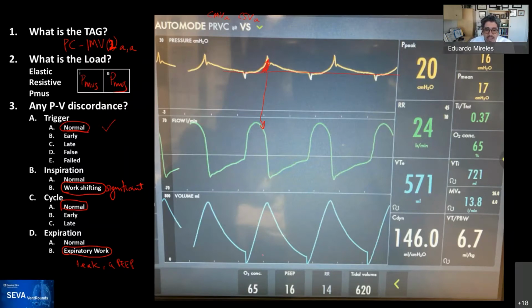And there is a comment here that I think is important for all of us to recognize. When you see the square root sign over here, this thing over here, and it's a constant, every breath the patient has that, the patient would be dead after 10 of these breaths because the lung would be exploding.